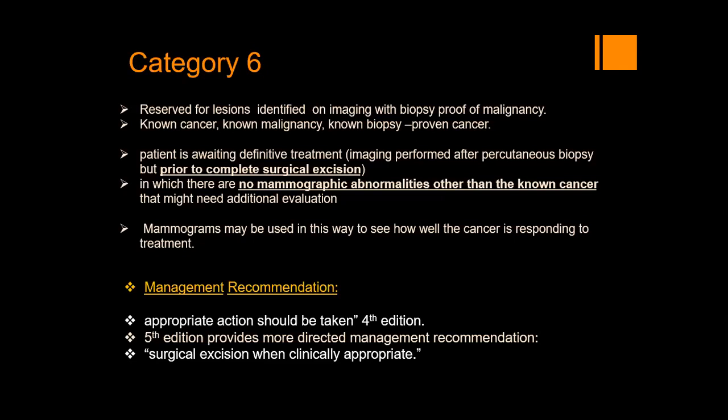This is one of the indications for imaging, and we report the lesion as BI-RADS 6.